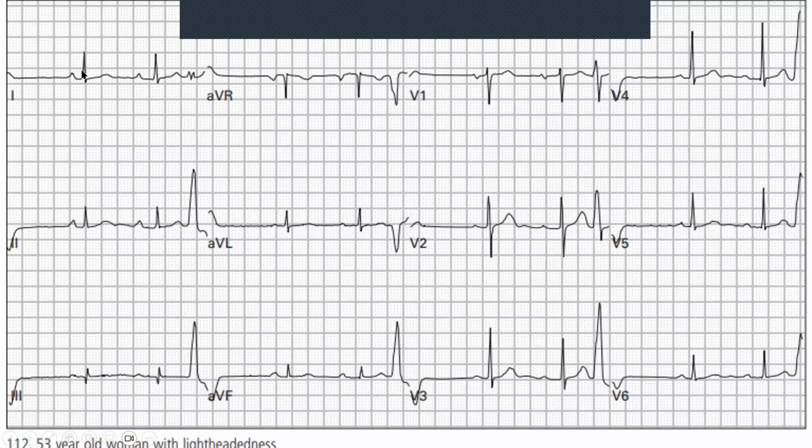We've got about 1, 2, 3, 4. So it's borderline, all right? And what's the next one? Yeah, it's about 7 blocks, all right? And we look, that's quite consistent everywhere. It's short and then it's long. It's short and then it's long. So it's a PR interval that's growing. So it's already not a normal rhythm.